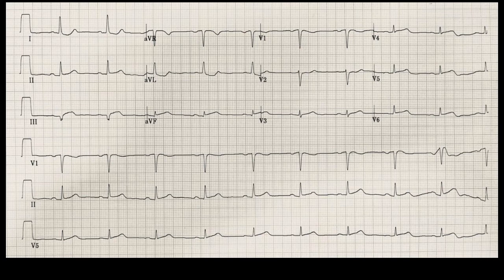Again, if you think about it, we start here with septal leads, anterior leads as we're walking our way through, and then we get out into some of the lateral leads like V6. You see up in lead 1 and AVL, the lateral leads that we usually think of, the ST segment is beneath this line here. So that's not ST elevation, that's ST depression. Same thing here, pretty pronounced. Same thing here, ST depression in lead AVL. So we've got ST depression in lead 1 and AVL thus far, a little bit of ST elevation in V6.